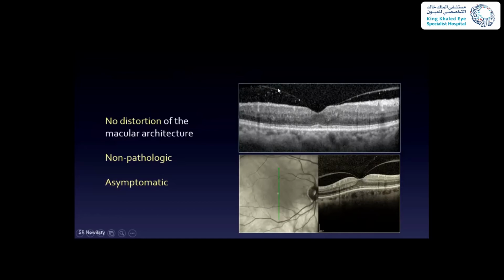What do we call it when you have the vitreous attached to the retina? VMA. Yes, this is a vitreomacular adhesion, which is within the process of a posterior vitreous detachment. When a PVD happens, it goes into stages. At one point, the vitreous is detached posteriorly but still attached to the retina, at the fovea or at the optic nerve, and you get this VMA. And it can, of course, detach completely and leave the patient asymptomatic with no problem. So that's a VMA. You have an incomplete vitreous detachment because the vitreous is still attached to the fovea.